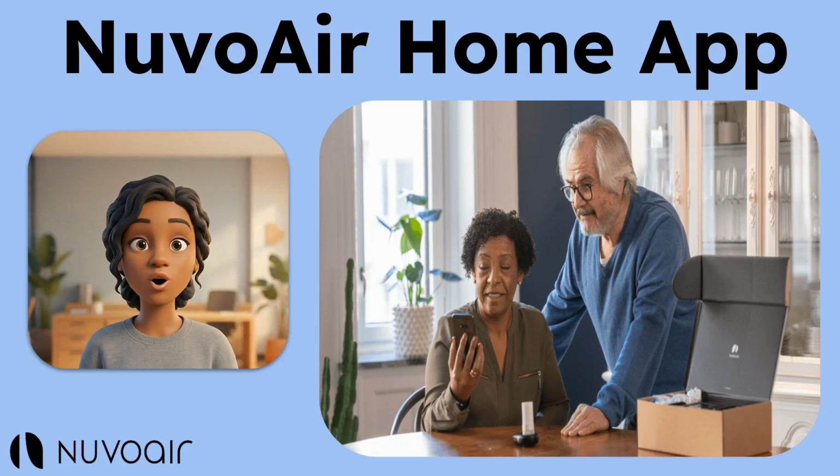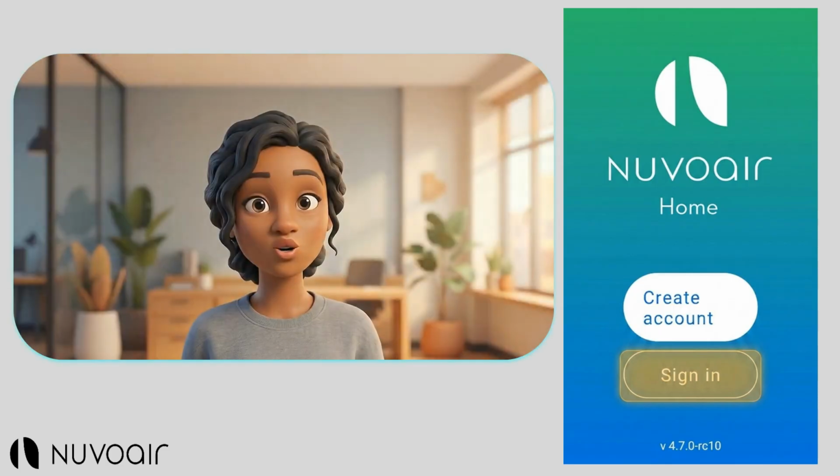Let's learn about the NuvoAir Home app together. Ready? Welcome to the NuvoAir Home app.